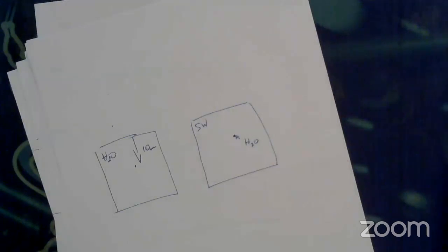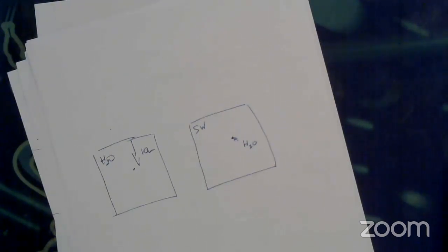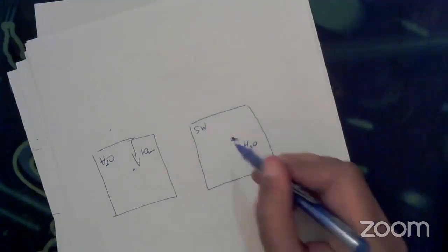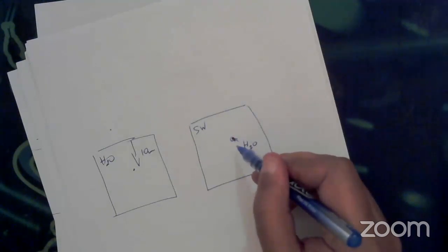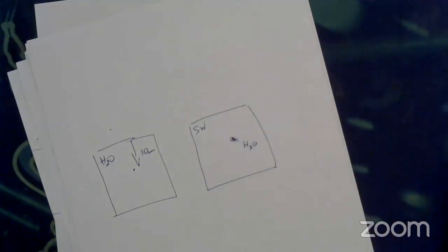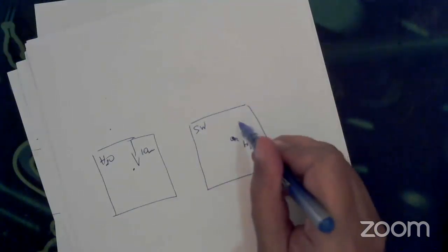The reason is your chamber has a factor, a conversion factor that gives you dose to water, not dose to the medium, specifically dose to water. So if you put the chamber here and take your reading and multiply it by your NDW, corrected for KQ or whatever, that gives you dose to water. So what you have done basically is remove the chamber and replace it by a small medium of water in that place. That small medium of water is surrounded by solid water.